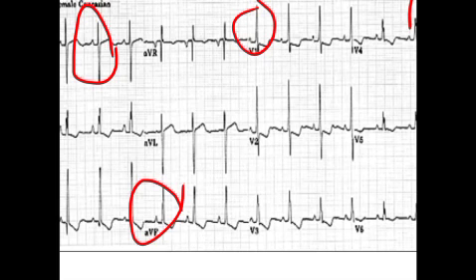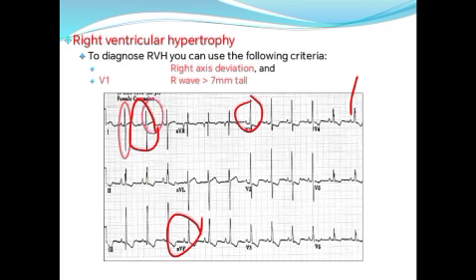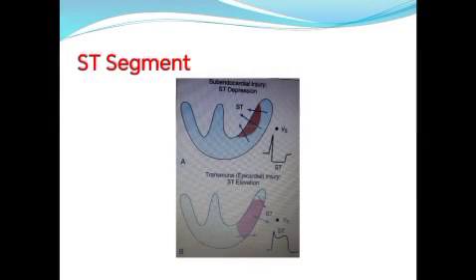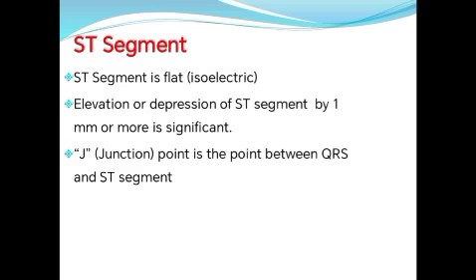So this is RVH, right ventricular hypertrophy. Okay, we stop here and then we can talk about the ST segment in the coming lecture. Thank you.